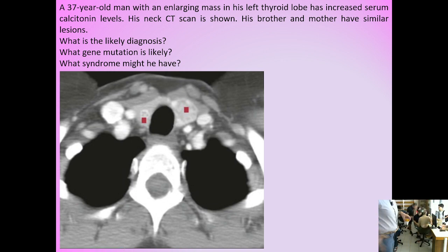So, as far as anatomy of the region is concerned, what could this be here? It's round and it's black. What could this be? No, because the thymus is a solid organ, and it shouldn't be black. Black means it has air. So, what is it? The trachea and the lungs, all right? Here are the lungs and the trachea.